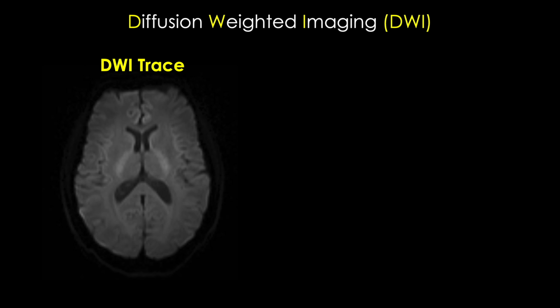Now, Dr. T.E. told me that you've already had an in-depth lecture on the physics behind diffusion weighted imaging and how we generate these DWI trace and ADC images. Link to that lecture is above if you need a refresher, but the quick summary is the image on the left, which we call our DWI trace image, sometimes also referred to as the B1000 or isotropic image, all the same thing, represents the average signal loss created by movement of our water protons.